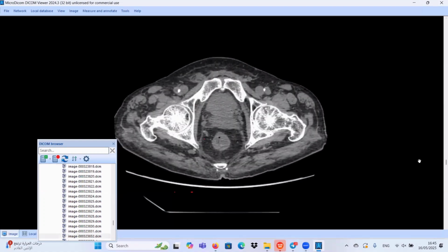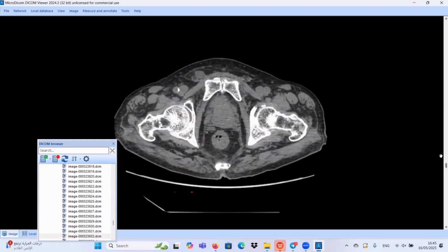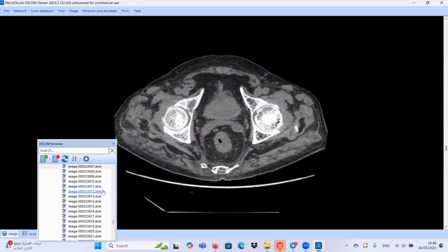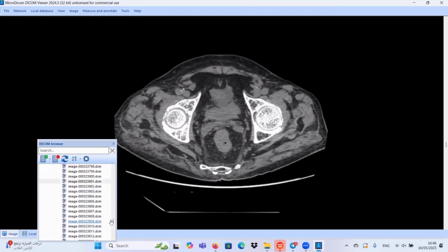Okay. Really, you did very well. When I saw this case the first time, I saw this CT scan of the pelvis, and I agree with you that we have an aggressive lytic lesion. Let's go to the bone window again.